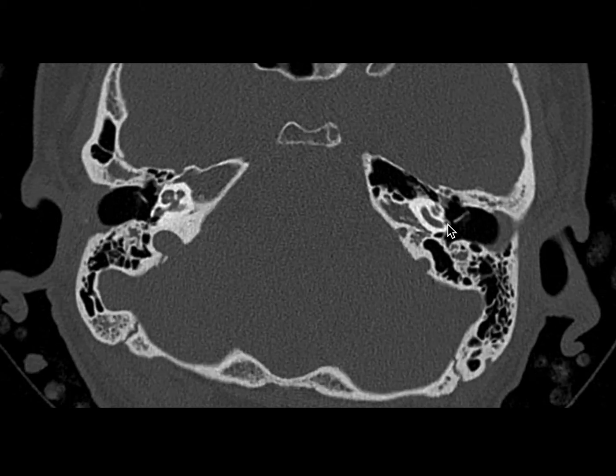Sometimes, this canal may become confluent with the facial nerve canal, resulting in widening of the facial nerve canal, or it may run parallel to it, as is seen in this case. Sometimes, the persistent stapedial artery instead arises from an aberrant internal carotid artery.